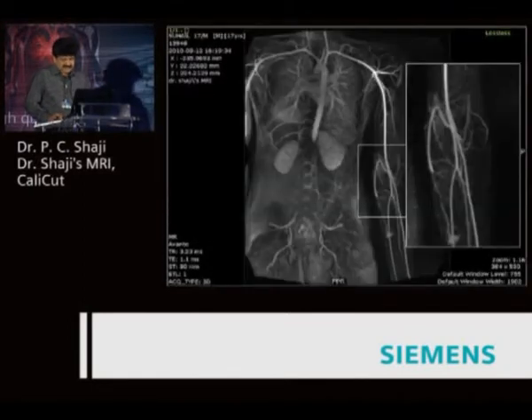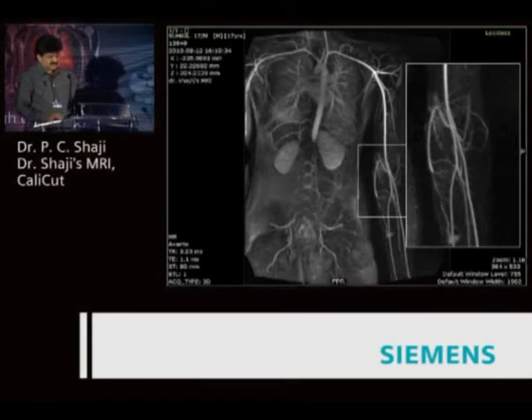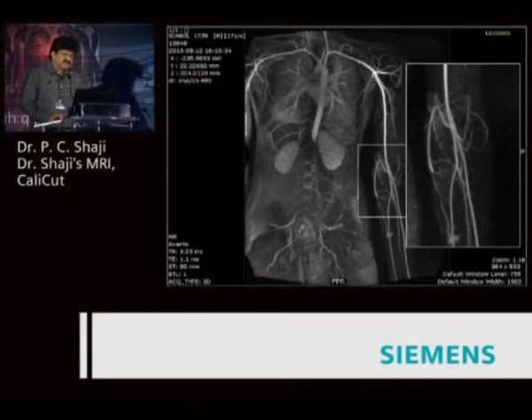This case was for evaluation of a venous angioma, to rule out an arteriovenous fistula. You can clearly see some enlarged vessels, but these were not actually arteriovenous fistulas. These were just venous malformations, which we could see when we rotated the images. So we could image the entire arterial system using our MR.